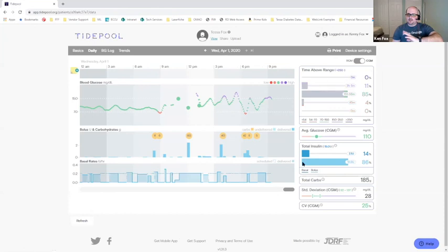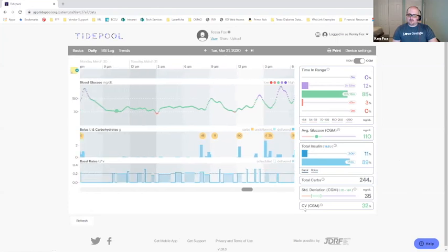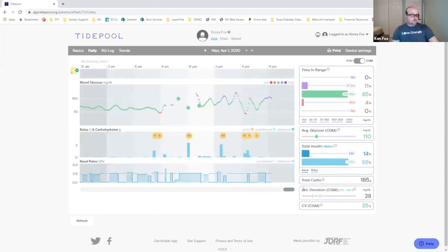So I'll grab a screenshot of like this screen here, or I'll pick a day. Oh, this is average. Okay, good. There it is. Yeah, 19.2 for that day. So I'll grab like a screenshot of this data because the total daily dose is accurate. If they had insulin on board listed here, then I'd be a fan, but it doesn't. So also not useful. But it's, again, how much is delivered per basal click or per basal rate change is accurate in Tidepool. So that's where you would go to get that for your actual total daily dose.